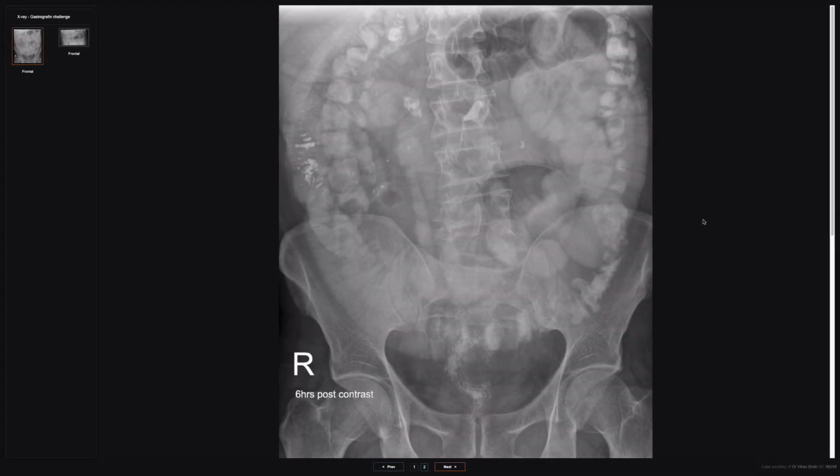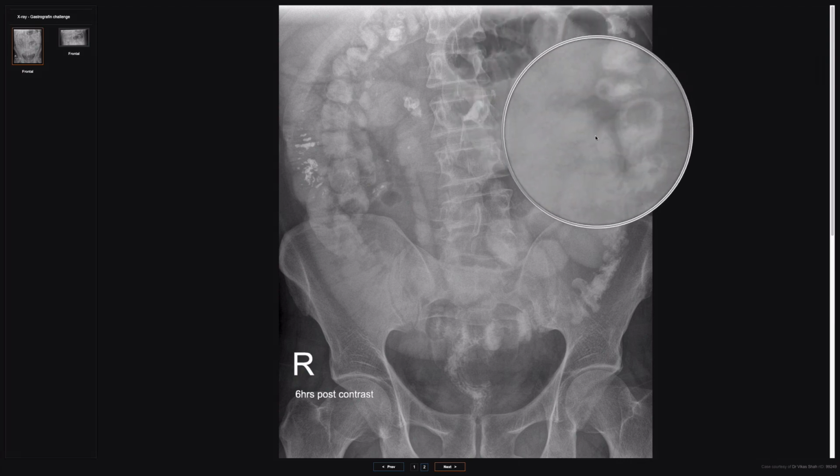And then the patient had a subsequent CT because they weren't recovering, and there's some distension which showed vague distension of much of the small bowel, no hard transition, bit of free fluid. So they gave a Gastrografin challenge, and 6 hours after administration, what we see is that there is some contrast within dilated small bowel loops here on the left side.